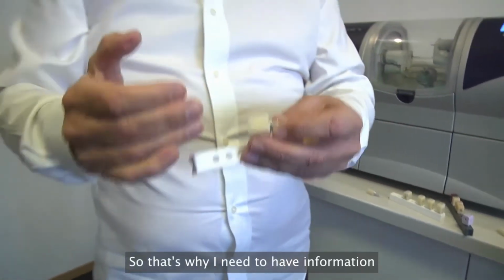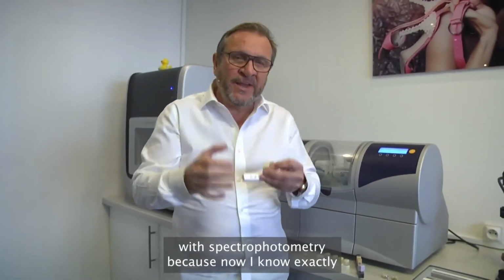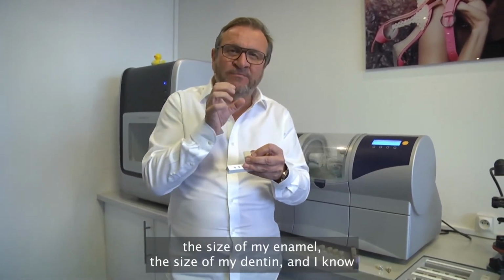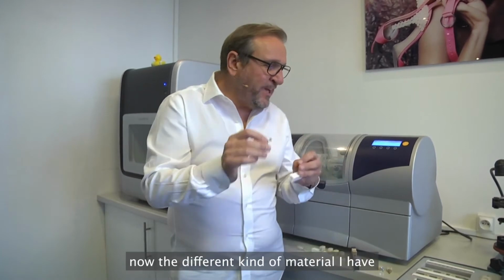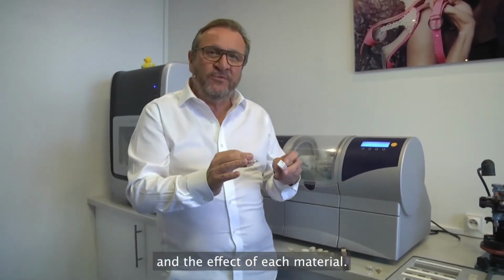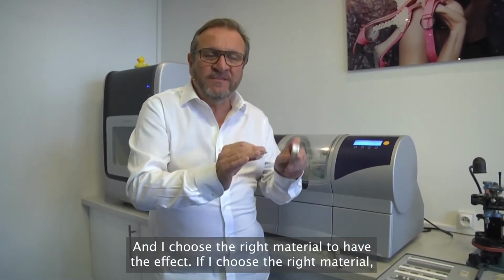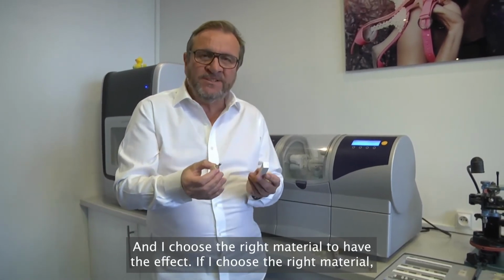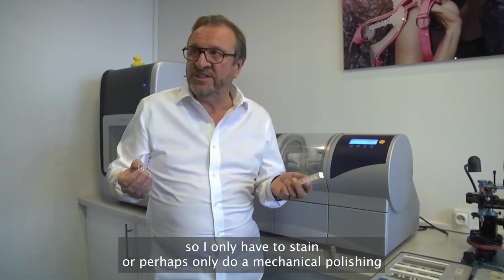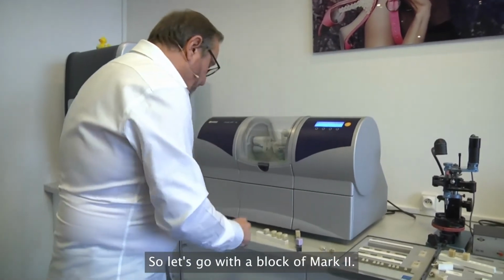So that's why I need to have information with the spectrophotometer, because now I know exactly the size of my enamel, the size of my dentin, and I know now the different kinds of material I have and the effect of each material. And I choose the right material to have the effect. If I choose the right material, I only have to stain, or perhaps only do mechanical polishing, and have a good result. So let's go with a block of Mark II.